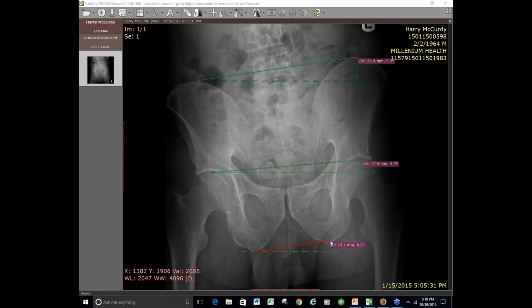Well, you said you added 8 on your bottom angle. You added 8 millimeters to that, so I just added 10 and 8, 18. You said it equals the angle above. So I know this is where it gets confusing. What I did is I matched the angle, right? See that 8.2 degrees and the 8.2 degrees. But this was 10.8, and I brought it to 15.1 to get there. So what the real calculation is, take 15.1 and subtract 10.8.